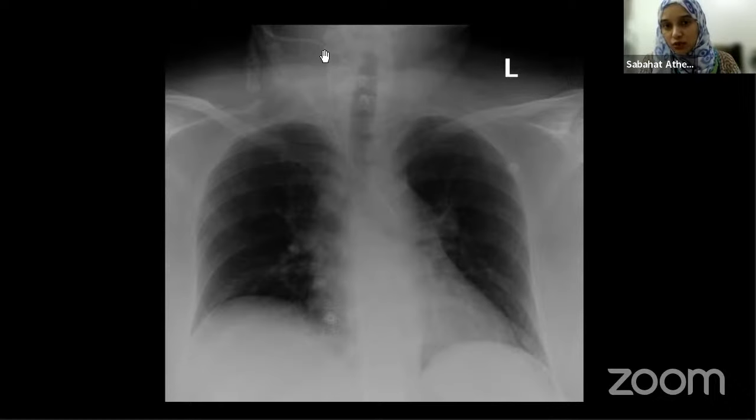Because the line is starting quite high up, right, from the neck. Malpositioned central catheter. Excellent. Everybody got it. Yes. So what do you think? What can I tell them? Lateral chest X-ray. Okay, that's a good option. What else? Fluoro. Okay. Yeah. But then we have radiation.